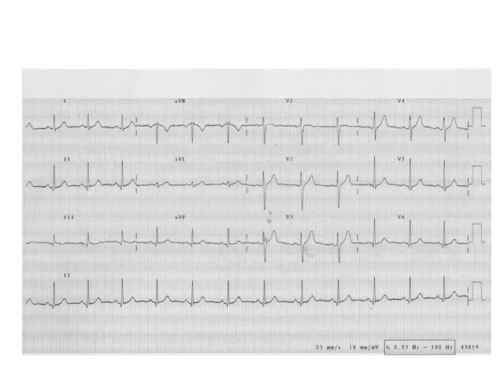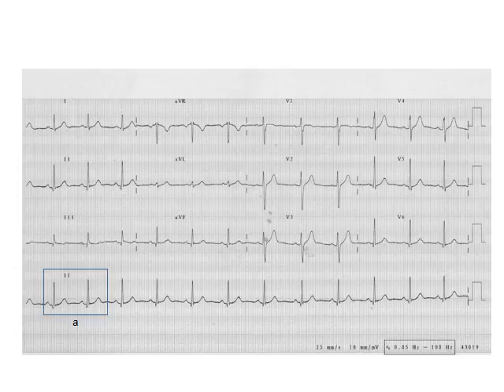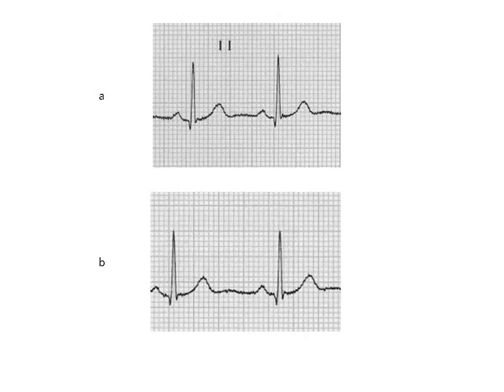What I'd like you to do now is calculate the rate of this ECG. I would like you to tell me what is the rate at point A and what is the rate at point B. I want you to give me the exact heart rate, so use the small square technique and divide into 1500. For easier reading, I've zoomed in on section A and section B for you. You should pause now to do your calculation.